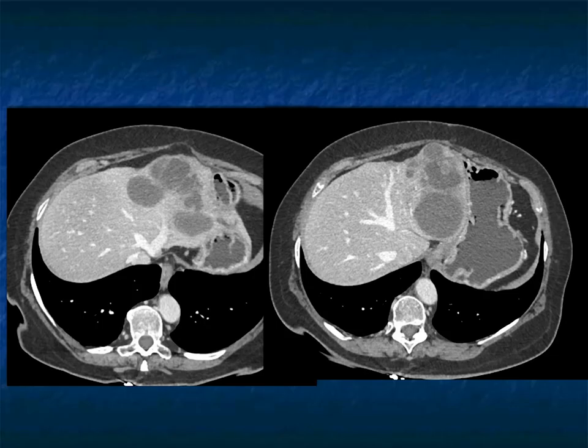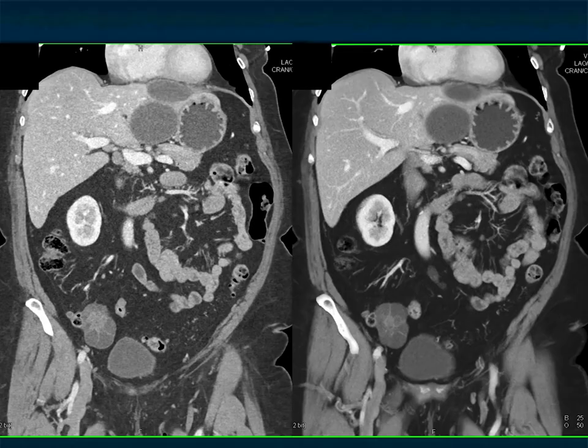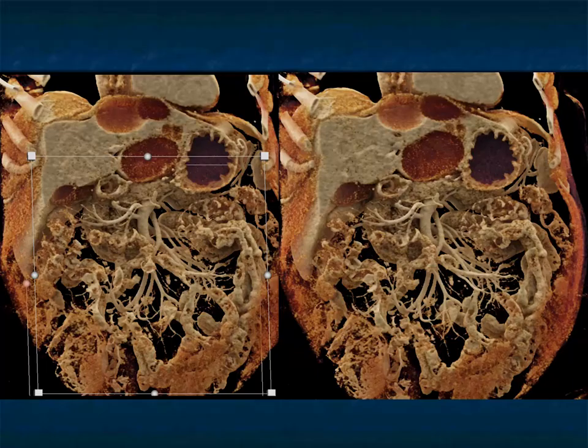Well, the same thing with this lesion. There are cystic changes and solid components present. Could this be metastasis from a GIST tumor? I guess it could be. Could this be a hepatoma? I guess it could be. This kind of looks like a primary liver lesion that's both cystic and solid. I don't see too much else in the abdomen except for a cystic lesion in the right lower quadrant, which could be coming from the appendix. And again, more images of the cystic lesion in the liver.